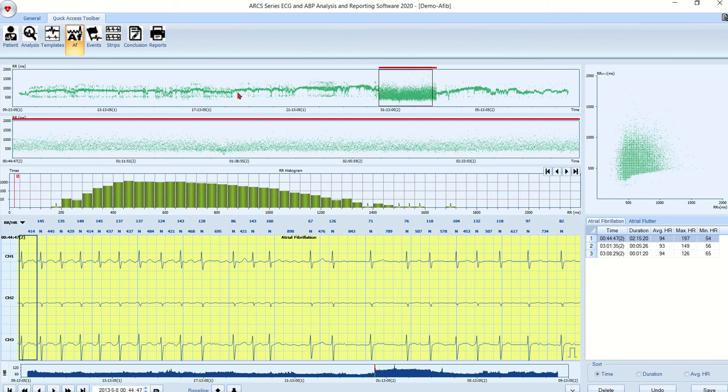This R2R stream represents every beat for that patient. In this case, it was an entire 24 hours. The particular Afib session is highlighted or encased in this box. This box is expanded and displayed in the second row of the R2R graphic representation.